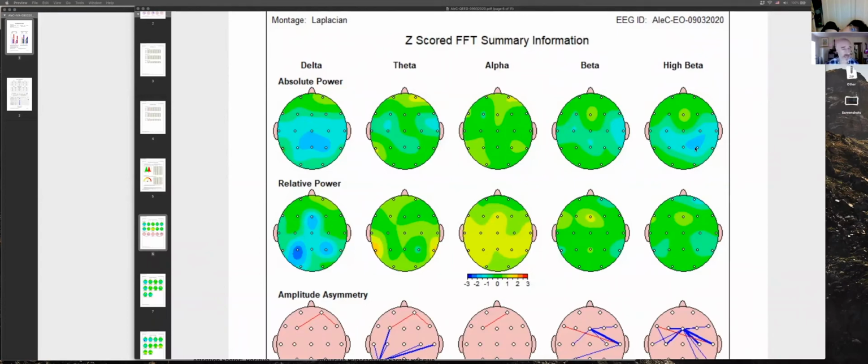Yes, beta is an engaged gear in different little regions. Like this little area is a little hot in beta, so it's the anterior cingulate. That one is doing more work right now. More anterior cingulate brainwaves, that's perseveration. Exactly right. Or the whole stripe is happening here, anterior cingulate and posterior cingulate. So yes, perseveration, some rumination mixed in there. You see little hints of it, and there's some sensory stuff maybe, nothing dramatic. Most people have big red blobs.